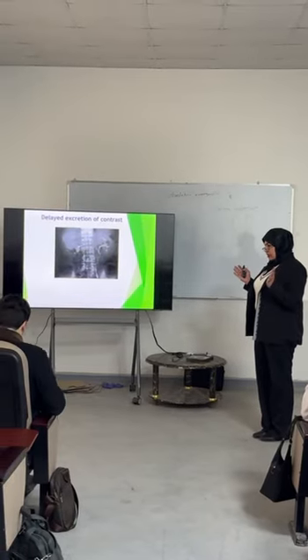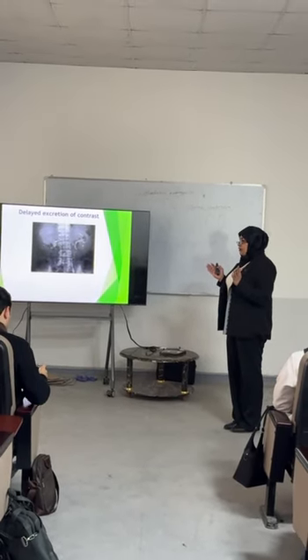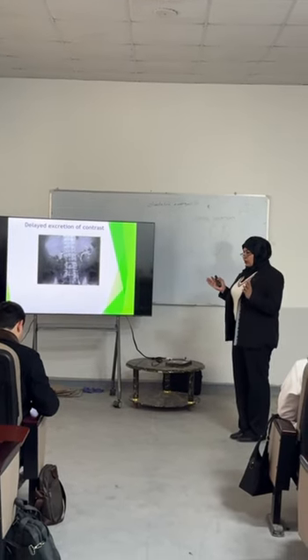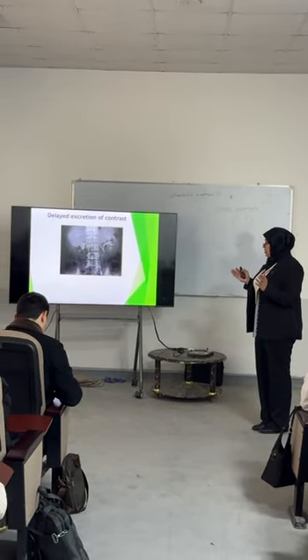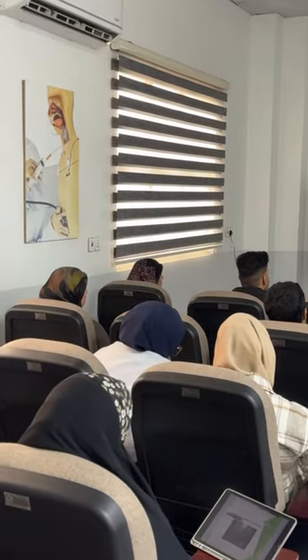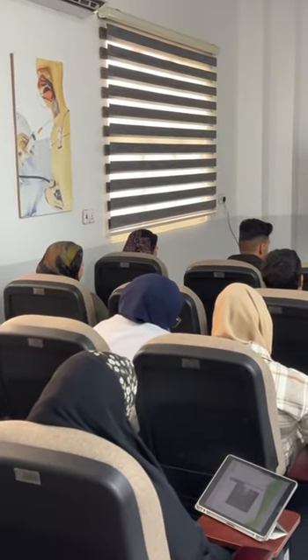Contrast study. The name of the investigation: IV contrast study. First of all, normal excretion of the left side. The other side, what do we call this?